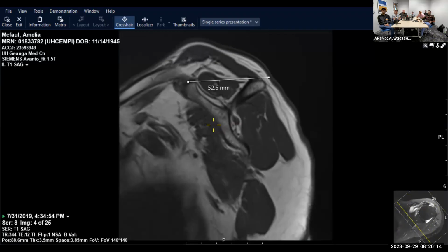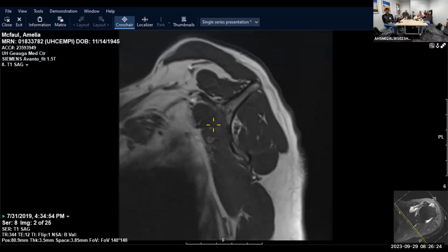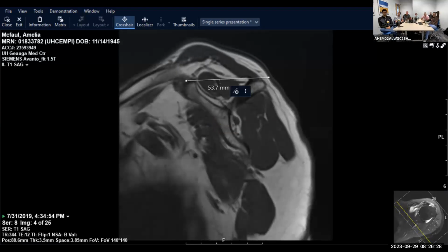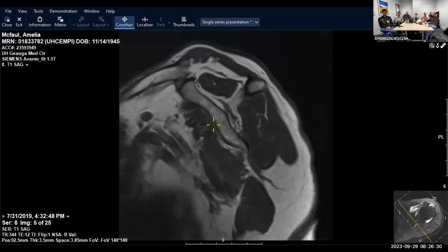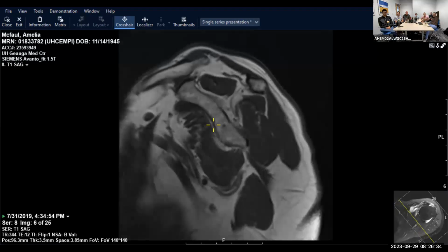Also, I tell people, you don't want it to look like wagyu. You want a nice lean steak. So more wagyu, more fat, it's not good. So this one I'd probably pass on muscle atrophy, at least related. It seems like the muscle bulk is all relatively similar. There's no pronounced muscle atrophy in this particular case.